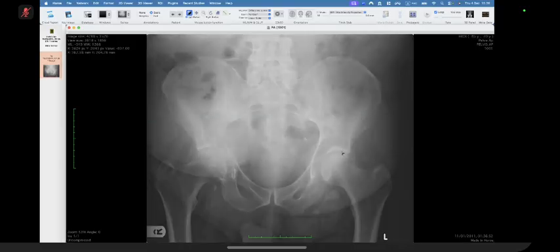I'm going to put it on auto windows. And even then, you can clearly see the margin, the iliopectineal line on the left side. It's disrupted. There is no iliopectineal line. This is one of the areas where I was actually told to look. Thank God for Nigel Raby. I don't know whether anybody knows his name. He's actually retired a long time ago. He was the very first MSK radiologist I encountered, and one of the very first cases he showed me was an iliopectineal line disruption for a fracture. So as a musculoskeletal radiologist, it's drilled into my head that when I look at the pelvis, I always look at the iliopectineal line to see if there's anything going on there. This is a metastatic deposit. This is bowel gas, but this is a metastatic deposit until proven otherwise, okay?